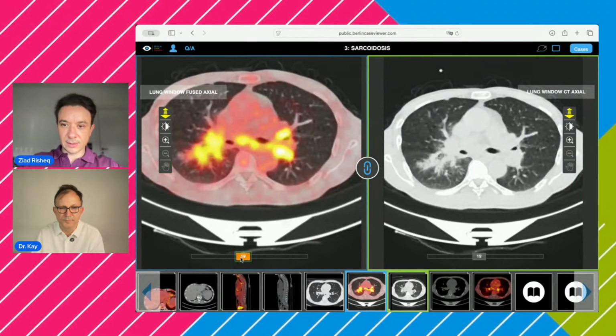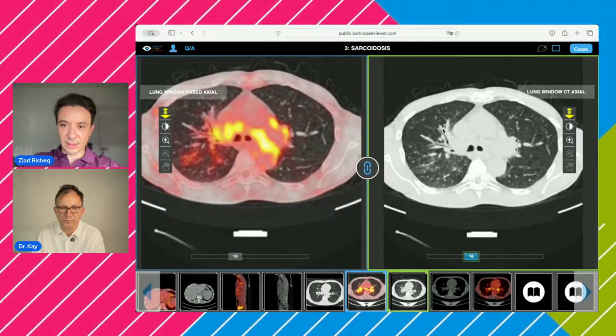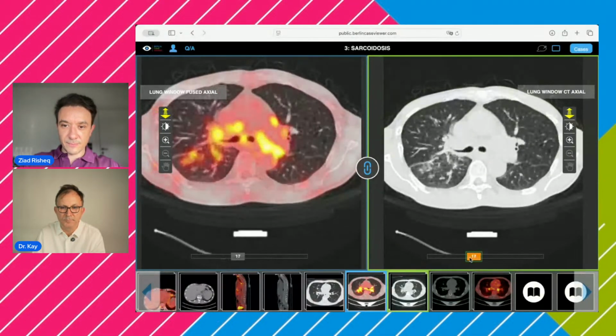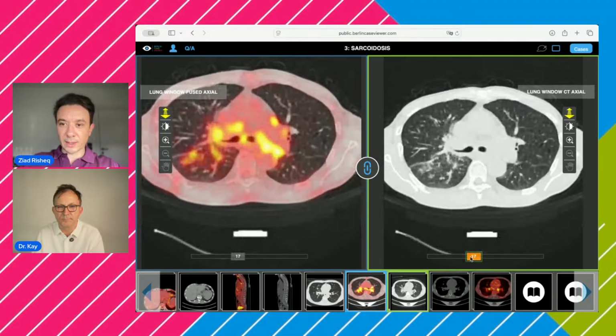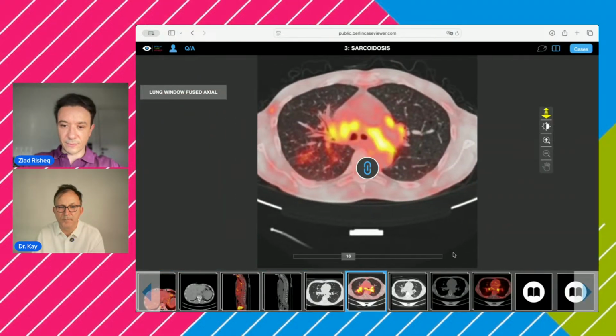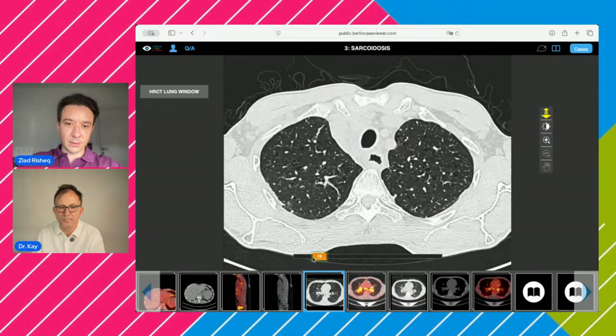Okay, this is the superior lobar bronchus. You can see this is the whale sign or the hump sign. So this is how we know we are in the upper lobe or the upper lobar bronchus. And you can see there is thickening surrounding the segmental branches. And here we can see a bit of fissural thickening. But I like to look at the lung, and if there is an HRCT, it can give you a clearer idea of what's going on.